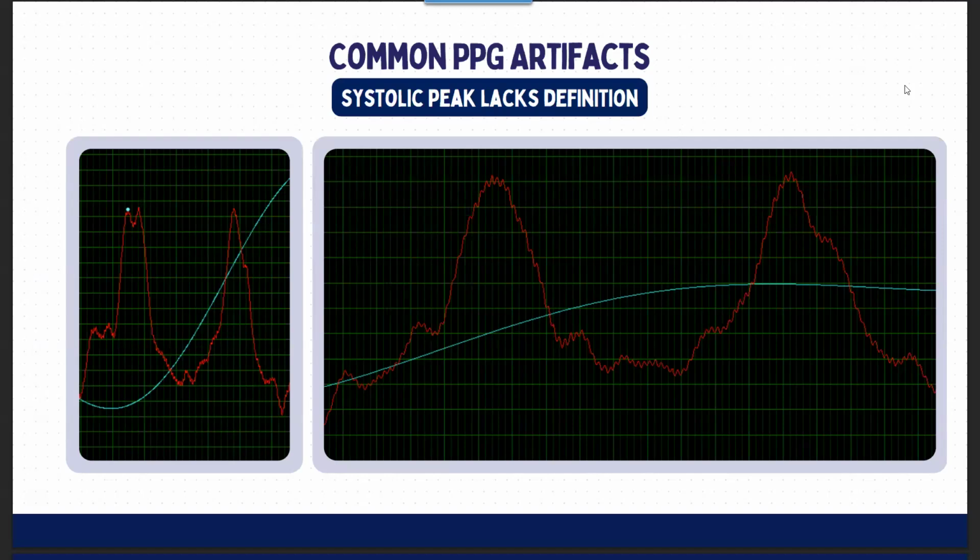And lastly, the other thing that we'll take into account here today really comes down to the differences that you can see in the data when talking about ECG, which is much more precise and has really great accurate timing, compared to some of the common issues that we'll see in PPG. So that being said, sensor placement is going to be very important, and movement is also going to play a big factor. When we have sections of movement, we may see that our peaks are going to get slightly distorted as far as not getting the same precision as typical.